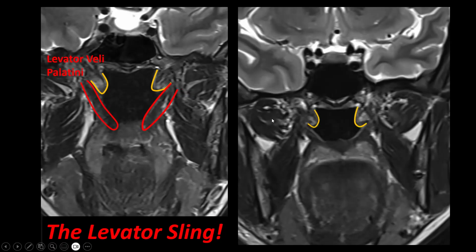This is another patient, just for practice purposes. We see the same things, the torus tubarius, and the levator veli palatini attaching to the uvula and the aponeurosis of the soft palate. We see that there is tissue of the soft palate which has different signal characteristics. This is the non-muscular part of the soft palate.